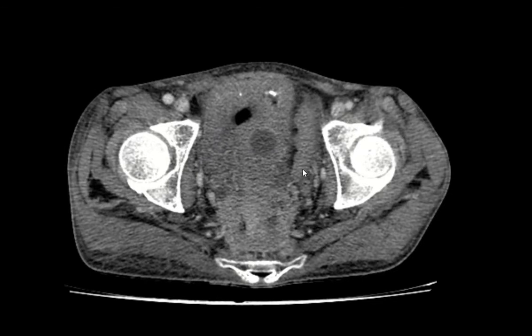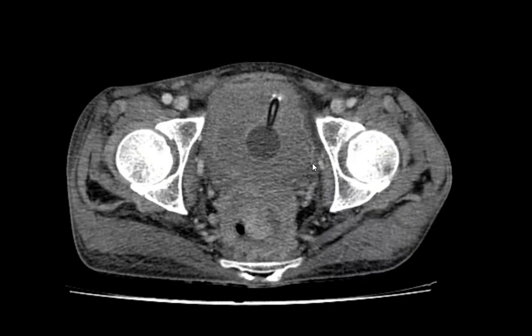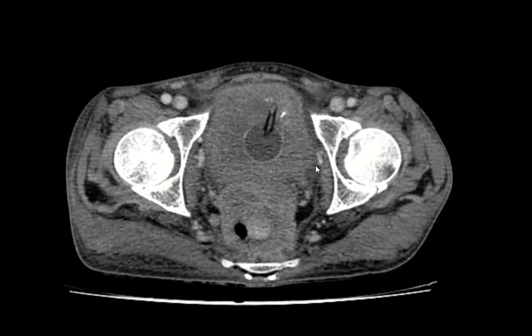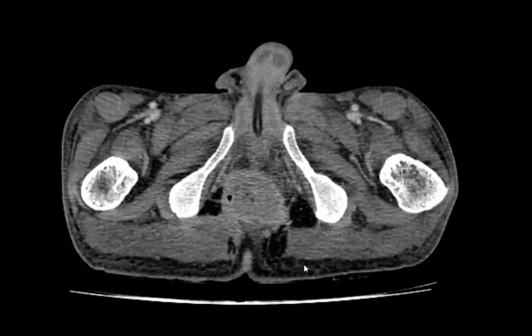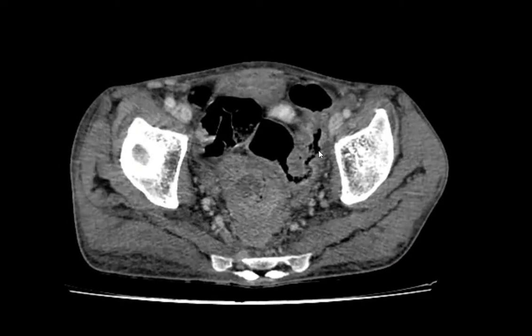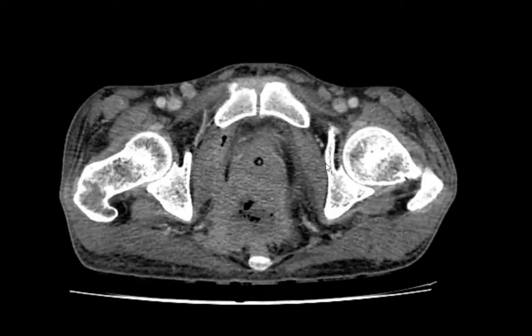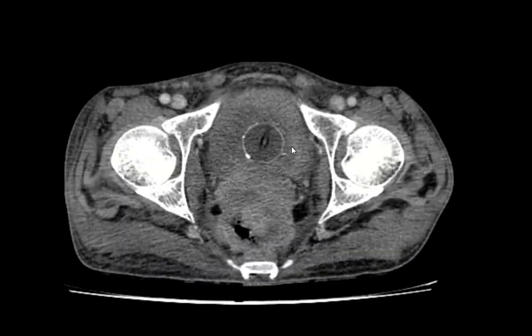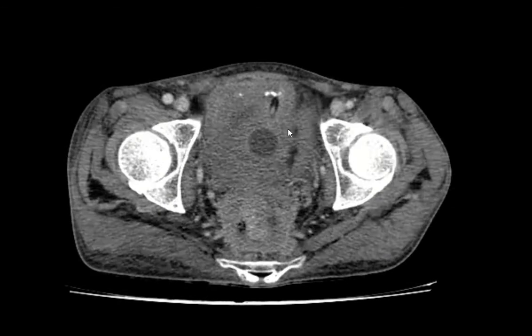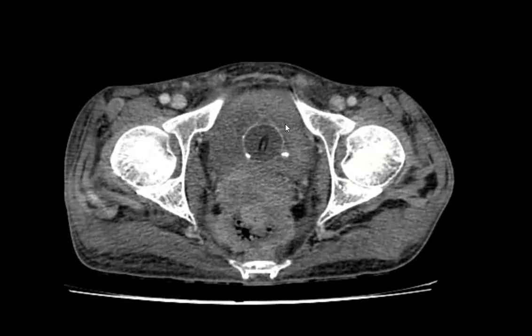What else I can tell you about this is that this prostate involvement is likely causing this patient's urinary tract symptoms, especially outlet obstruction of the urinary bladder, which has likely led to them putting a Foley catheter inside so that the obstruction could be relieved. At the same time, you can see some calcific foci inside the bladder, and the bladder wall is thickened as well.